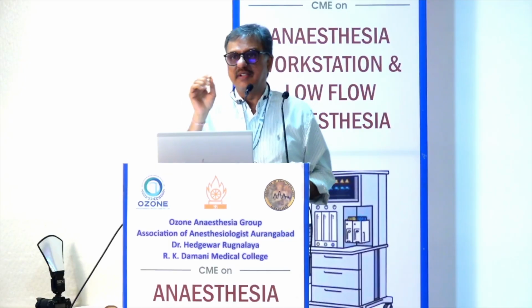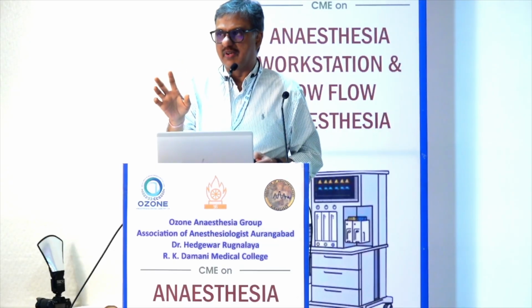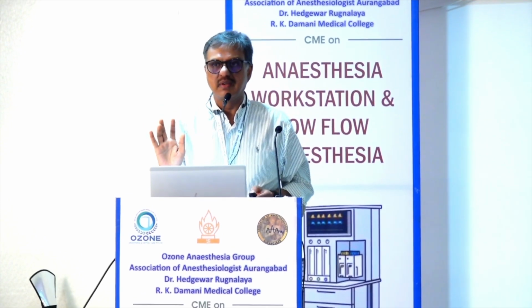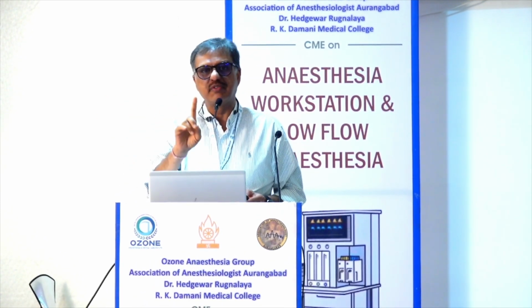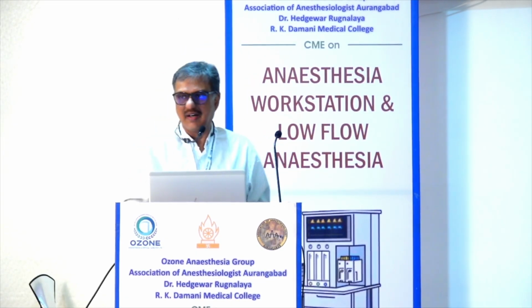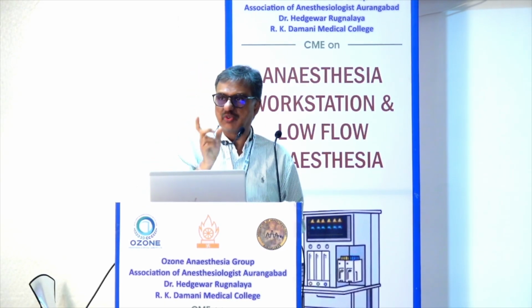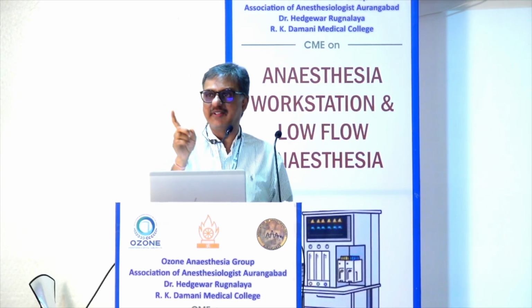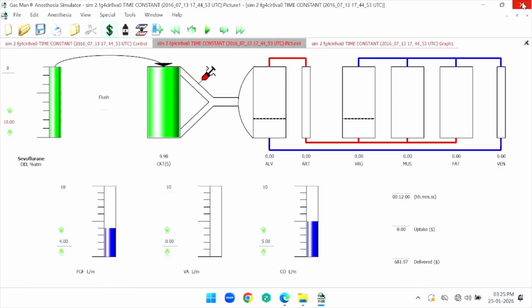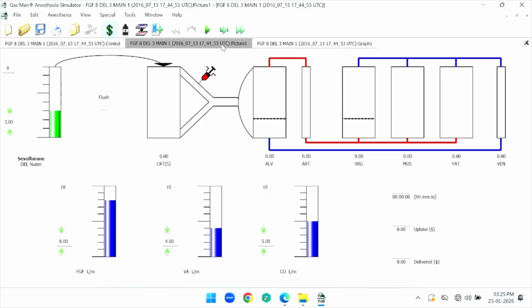And this software is free to download. For education purpose, you can download this software. It is free for 1 month. And if you generate 12 mail IDs, you can use it for 1 year. But the inhalation anesthetic it shows is only isoflurane. Only isoflurane. To get Sevoflurane, you need the paid version. But for understanding purpose, for education purpose, this is very good software. So all PGs should start playing with this rather than playing with the mobile. And unfortunately, there is no mobile app.